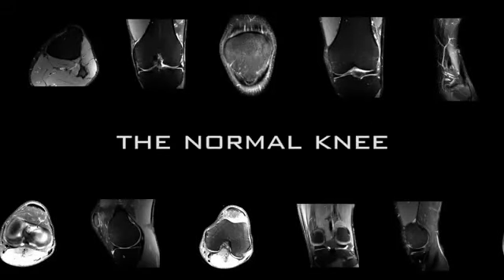So what I'll try to do is go through some individual MRIs to show what anatomy we're looking for, and one's knowledge of anatomy is a key to interpretation of MRIs. So this is on the left knee, and we'll start off with a coronal scan. A coronal scan goes through the knee from front to back, with the dimensions being medial to lateral in the knee.